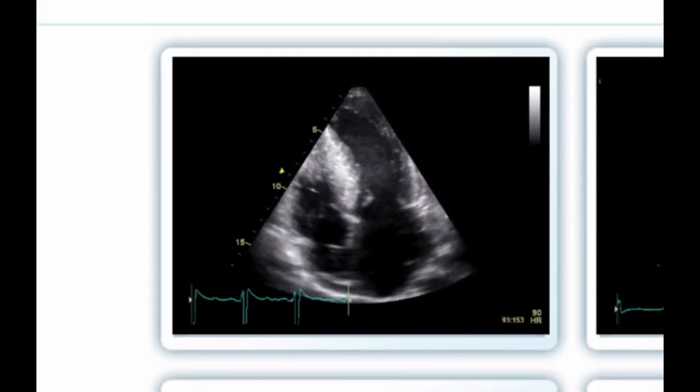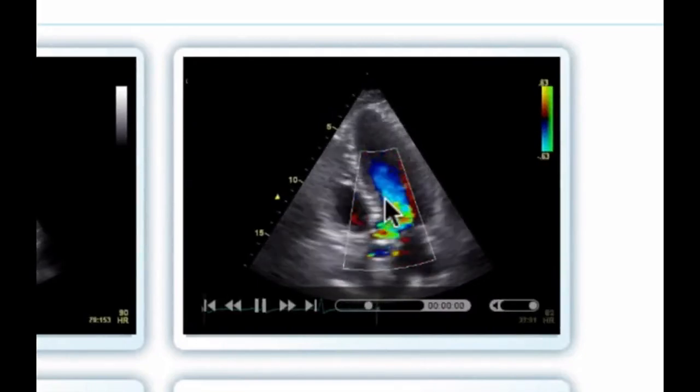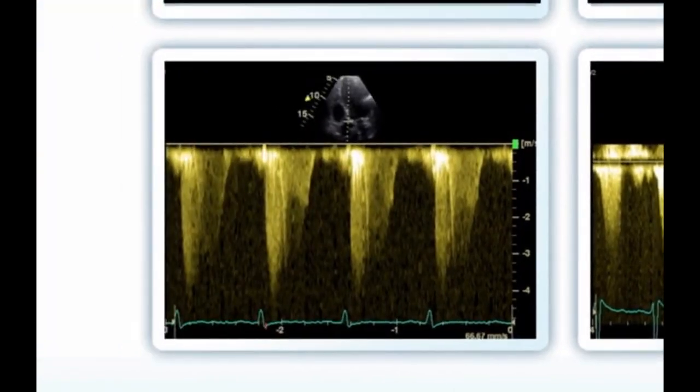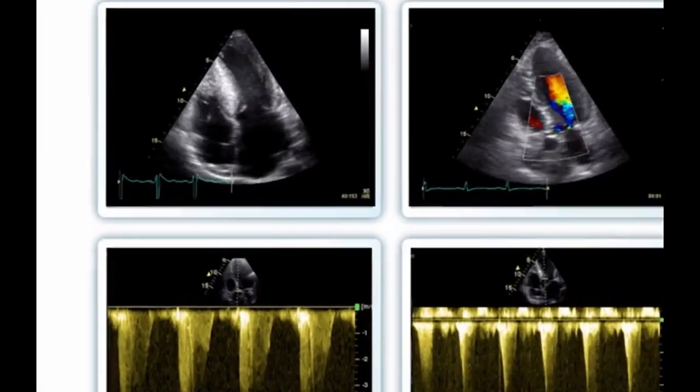And here again, in the patient with the LVOT obstruction caused by a hypertrophy in the proximal septum, we will usually find the typical dagger-shaped signal of hypertrophic obstruction or LVOT obstruction, and this needs to be differentiated from the AV velocity in the valvular stenosis. Look here also on the left side, note the SAM phenomenon.